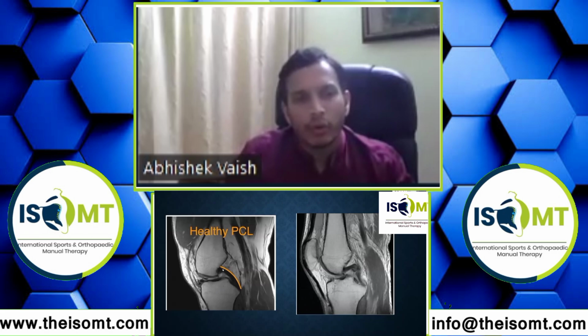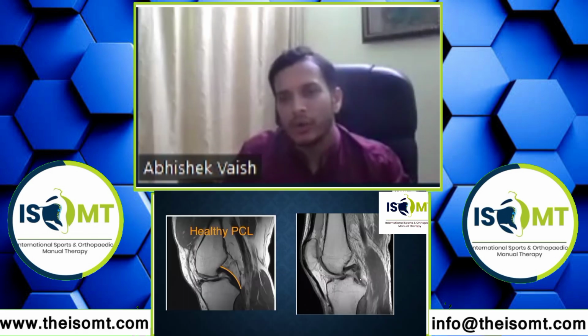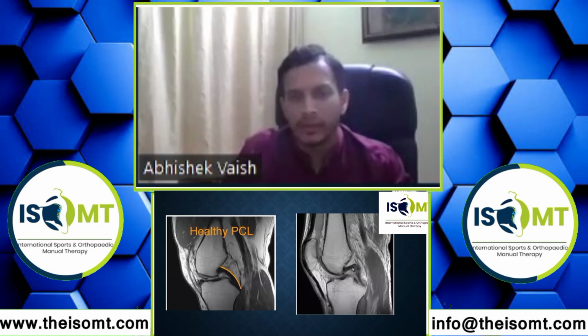This is an image showing a healthy PCL. You can trace the attachment on the femur as well as on the tibia very nicely. But in a torn PCL, you can see that there is loss of this continuity, and these fibers have become very bulky.